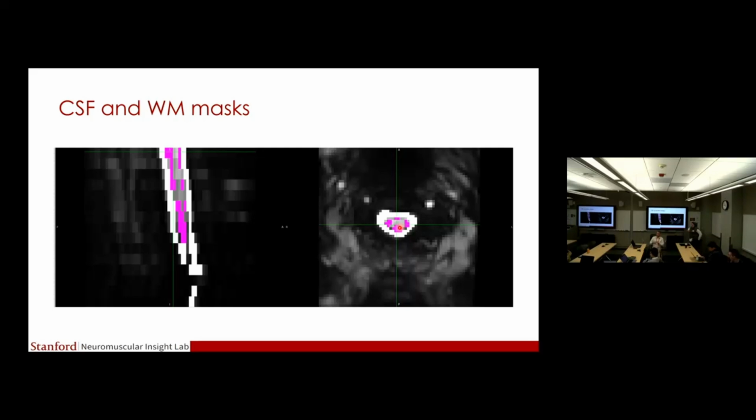So spatial resolution could affect your ability to register to the template. You think? I don't know. Yeah, since we are getting the signals pretty smooth, I feel like we would lose this ability, for example, if we have really big voxels.